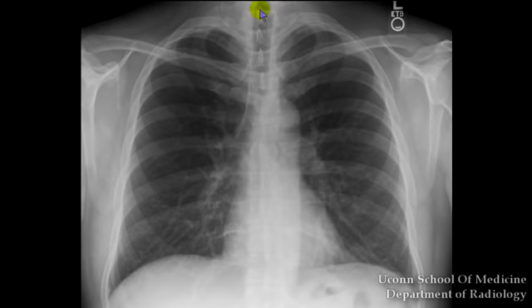Begin assessing the structures. You must be systematic. In other words, you should have a sequence that you run through each and every time for each and every film. Make sure the sequence covers all structures. You want to be thorough and complete. Let's run through a sample sequence.